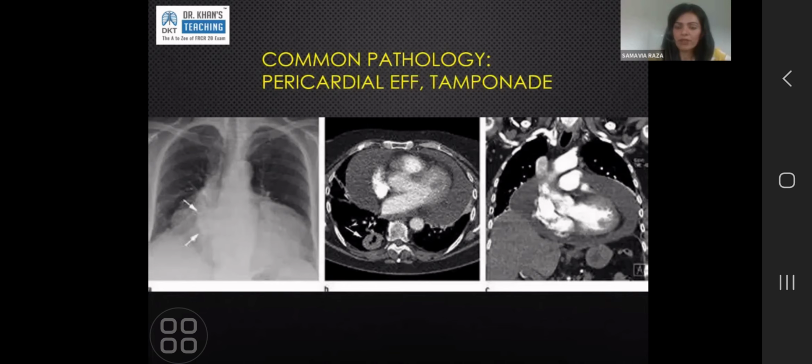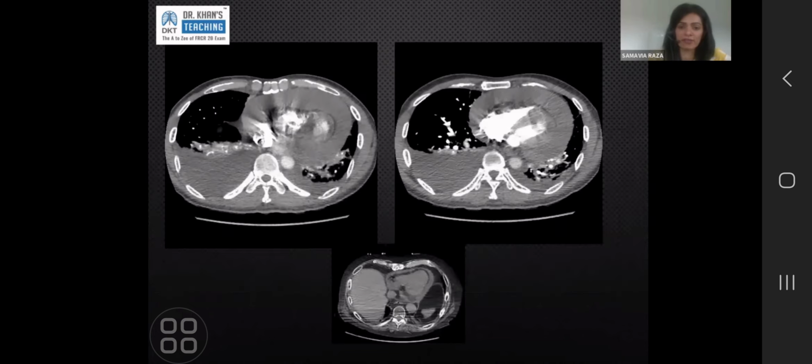The imaging diagnosis is whether there is or isn't pericardial disease. So you will comment on the pericardial thickness, you will comment on the amount of fluid, the type of fluid. On CT, even if you have convinced yourself that there is straightening of the septum or bowing of the septum, that this is right heart strain and impending pericardial tamponade, cardiac tamponade, I would say don't, because if you compare it even to a small pericardial effusion, you can convince yourself of this bowing of the RV free wall even when there is only a small amount of fluid.